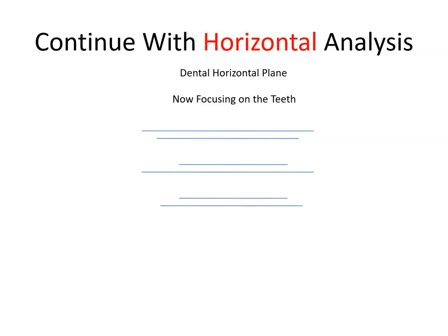So we continue with the horizontal analysis. We reviewed the dental horizontal plane. Now we're going to focus on the teeth. Now we're jumping even further beyond the lips, focusing straight on the teeth. And this is where these lines come in.